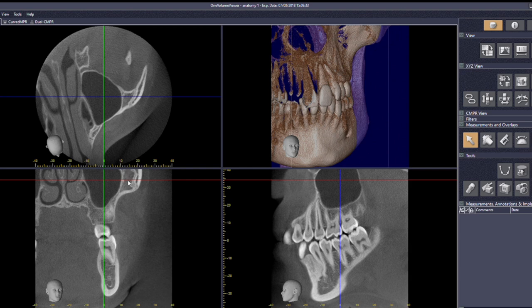When we look at a panoramic, we see the antral outlines of the trough, but when we look on cone beam CT, we get the antral outlines looking in the three planes all together. And notice the antral outlines are thin, pencil lines. And there's also a lovely curve to things. There's curves, curves, curves.